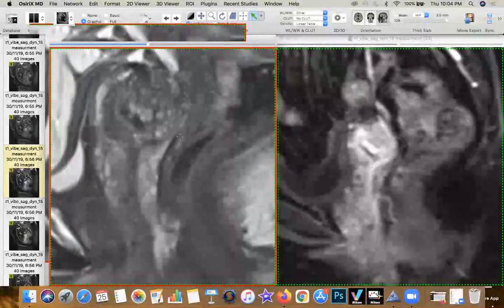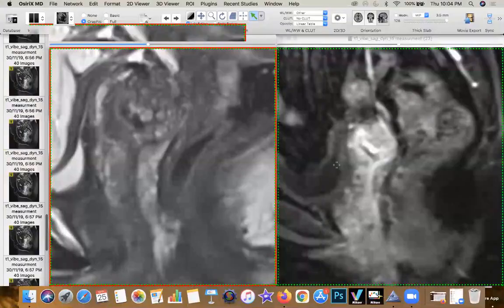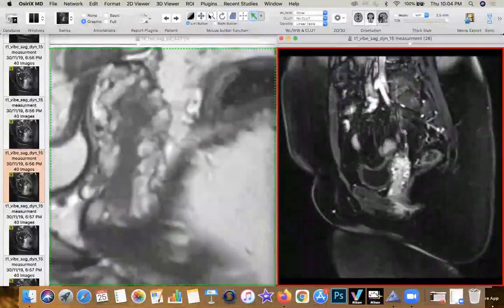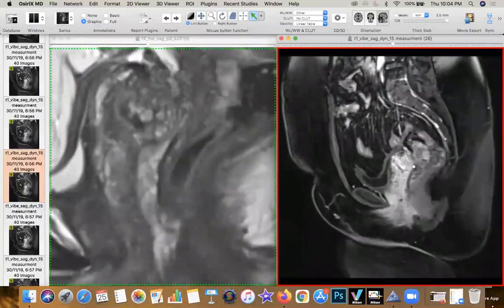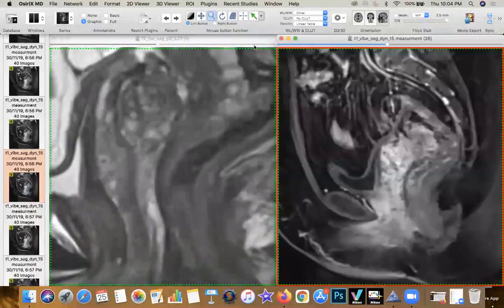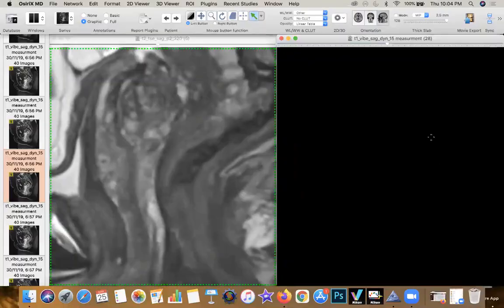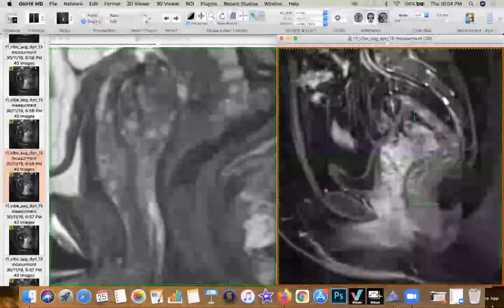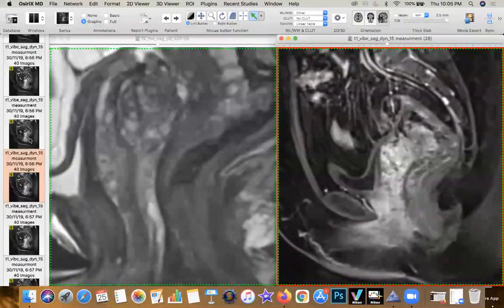You can see that it starts from the superior most edge of that black line and goes up all the way. When you see this on the later phases of the dynamic contrast, you can see that all those areas of enhancement are suspicious and have to be taken with a significant amount of consideration. Here you have chronic fibroinflammatory changes which are non-enhancing on the early phase. Here you have active disease within the rectal wall, the mushroom cloud appearance which you're seeing here, and the multifocal areas of enhancement within the vicinity of that fibrotic scar all need to be very carefully looked upon. What else do we need to see in these patients?